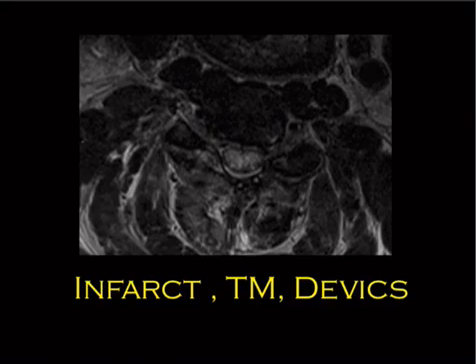And if they showed it to you in a sagittal, which I don't think they will because that's why this is tricky, you can actually have focal enlargement of the cord. It almost looks like an intramedullary tumor. And that's why they won't show it, because that would trick too many people, and then the statistics would be bad, assuming they actually run statistics on the test, which, who knows.